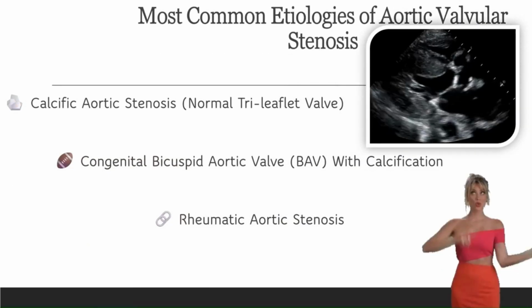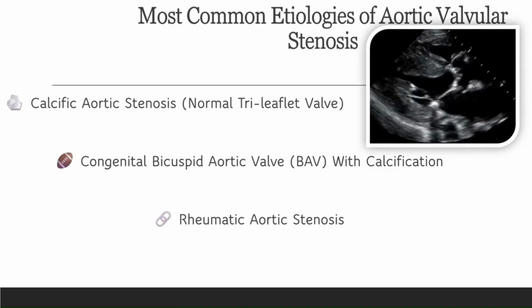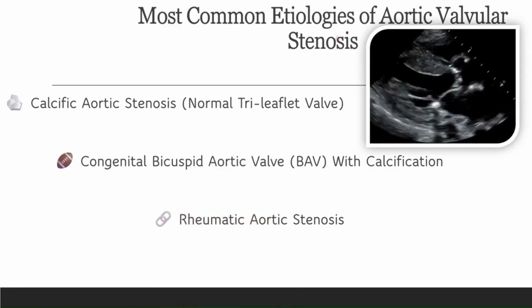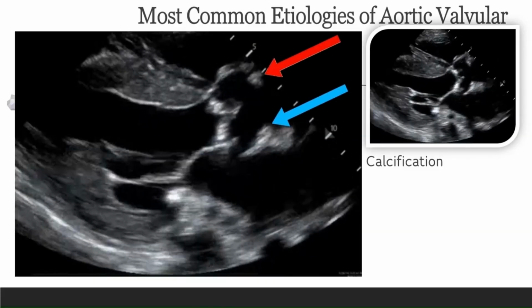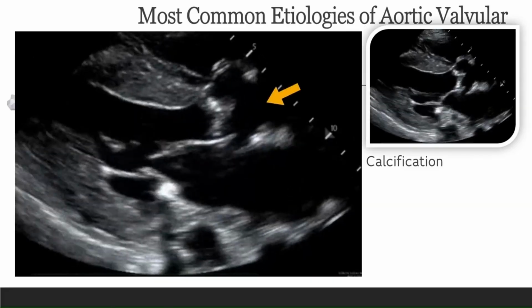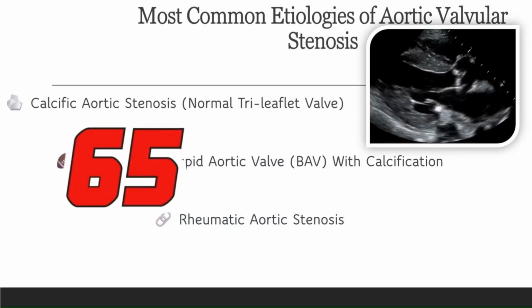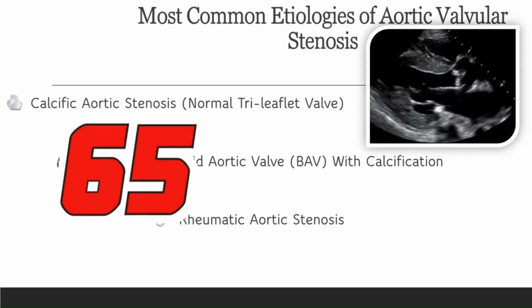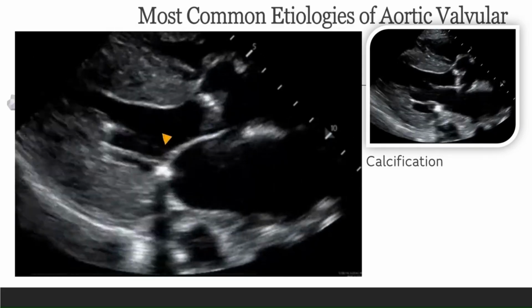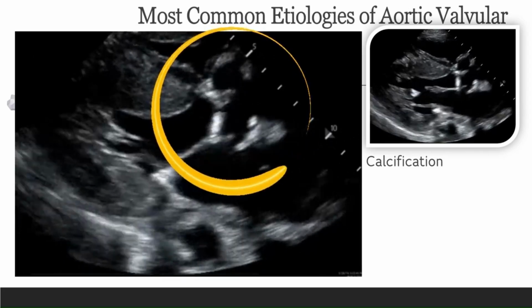If you direct your attention over here, this is what we often call degenerative aortic stenosis, especially in older adults. This is a slow fibrocalcific process that typically starts at the sinus of Valsalva and gradually creeps inward towards the cusp. The process usually affects patients 65 years and older. On echo, what you'll notice here is the classic appearance: thickened, stiff, heavily calcified cusps with reduced excursion.